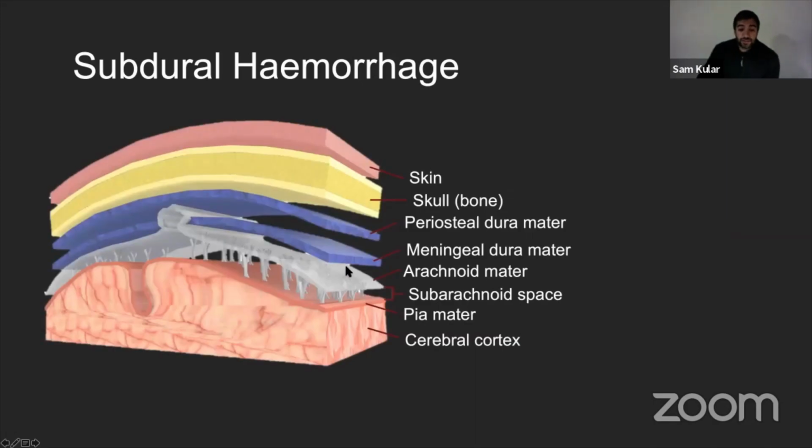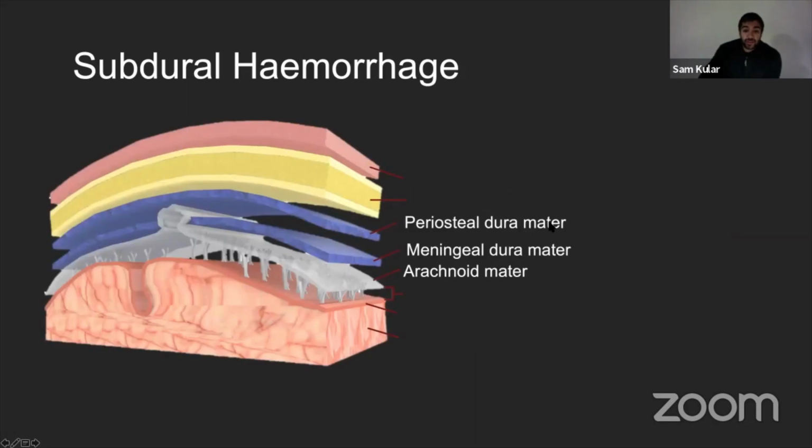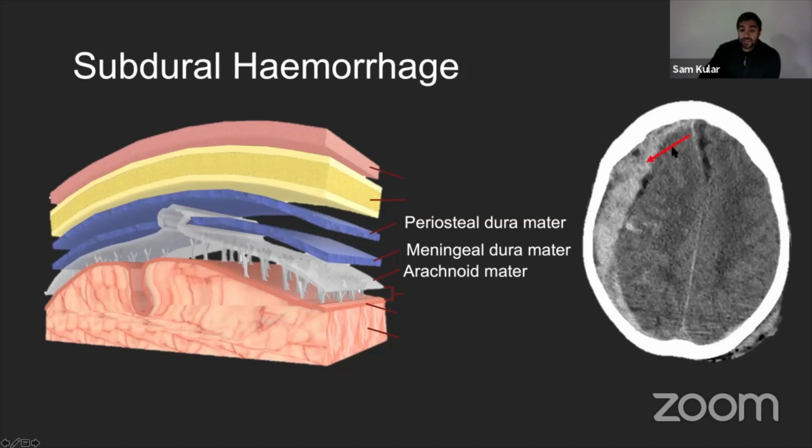This is different to subdural hemorrhage, which is between our dura mater and our arachnoid mater, between the blue and the grey spaces. So this often appears as a concave shape or crescent shape. And this has a different mechanism of separation to the sutures which we see in extradural hemorrhage. So in subdural hemorrhage, the prevention of crossing is performed by the dural layers.